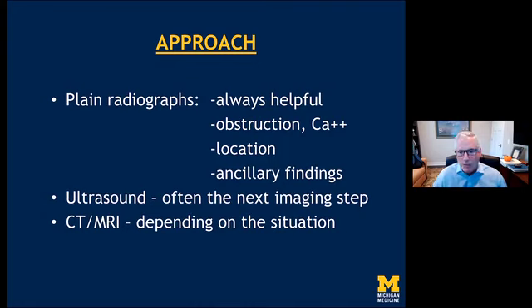So the approach. In this modern age of teleradiology and remote interpretation and advanced cross-sectional imaging with CT and MRI, we sometimes lose sight of the plain radiographs and their value to us when taking a look at patients who have abdominal distension or palpable abdominal masses or suspected masses. So I find them always helpful.